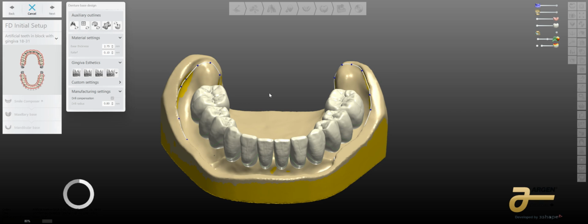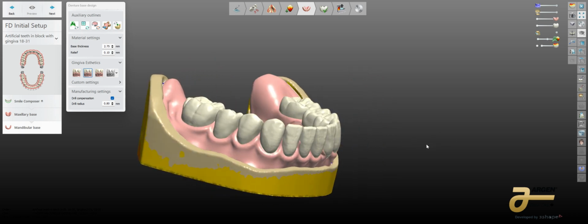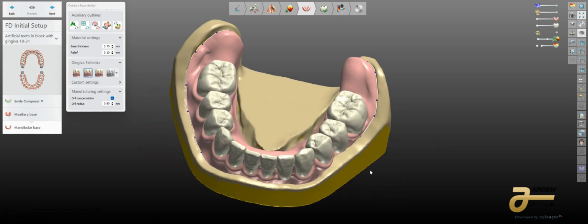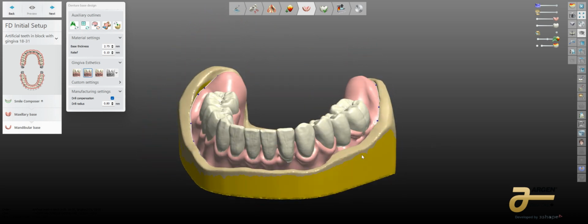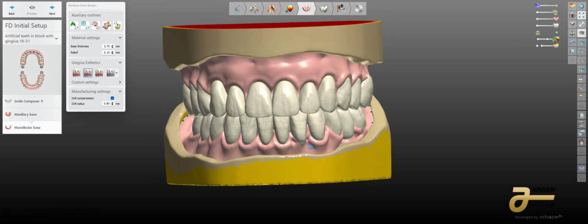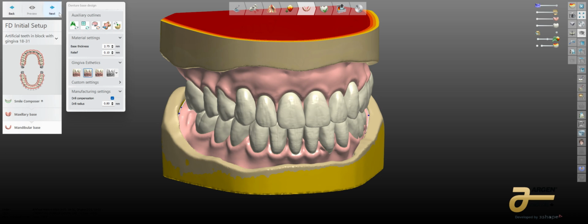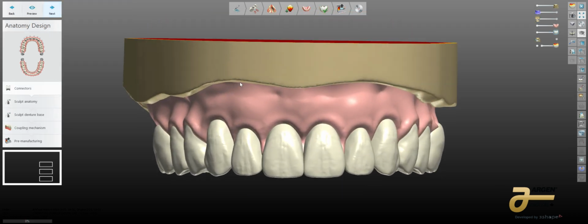You know, if they can't acquire a good intraoral scan, there's nothing to say that they can't take an alginate and then scan the alginate to send to you as well. All of those things are super powerful ways to be able to overcome some of the challenges. So again, the proposal for both of these arches, without doing anything to it, is somewhat close. You're going to see how fast it's going to be able to finish this case up.